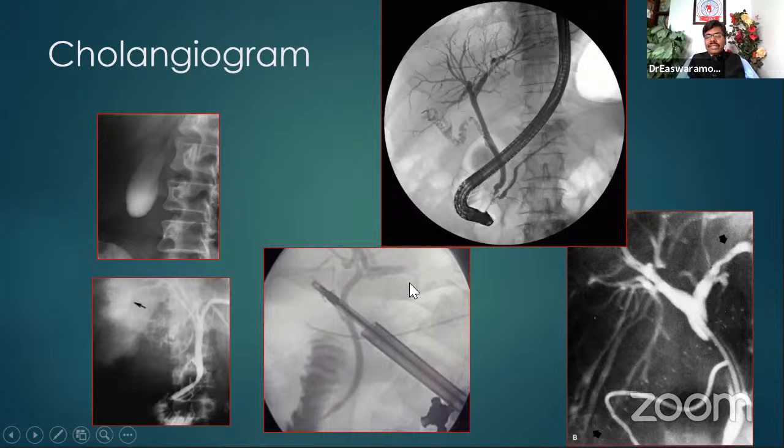Okay. Second thing is, after surgery, sometimes the patient will come with a tube like this, like a T tube. This is the long segment of the T, and this is inside the bile duct. T tube cholangiogram, post-operatively.